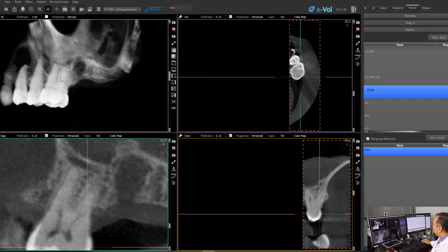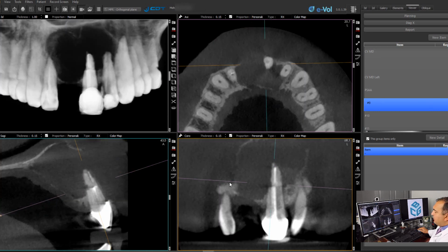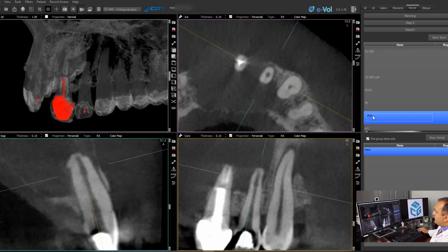Now it's time to appreciate what's happening with the anterior dentition associated with that big lesion in the anterior maxilla. You will notice that there is expansion and perforation of the palatal and buccal cortical plates, and there is extensive external root resorption associated with the central incisor. As we continue to evaluate the dentition, please note that there is also internal resorption with the lateral incisor.